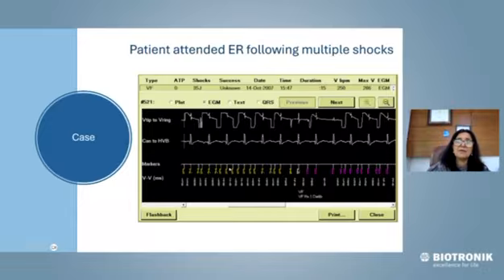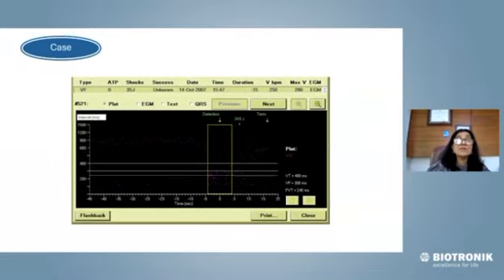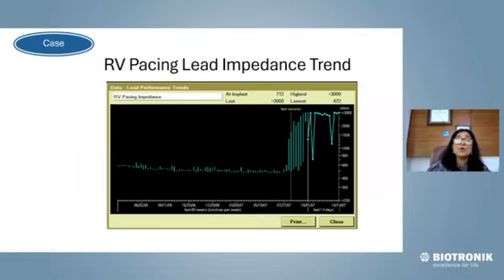Now how can this happen? It is detecting it as fibrillation while the far field says it is a stable rhythm. So there is a problem here. What is the problem here? Again, look at the scatter. The scatter is everywhere. The sensing has gone for a toss. It's sensing all abnormal parameters. Why is it doing so? It is doing so because of this.